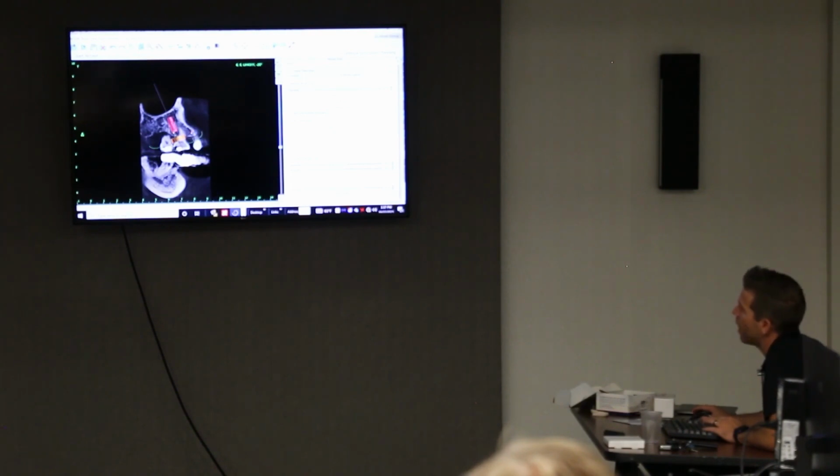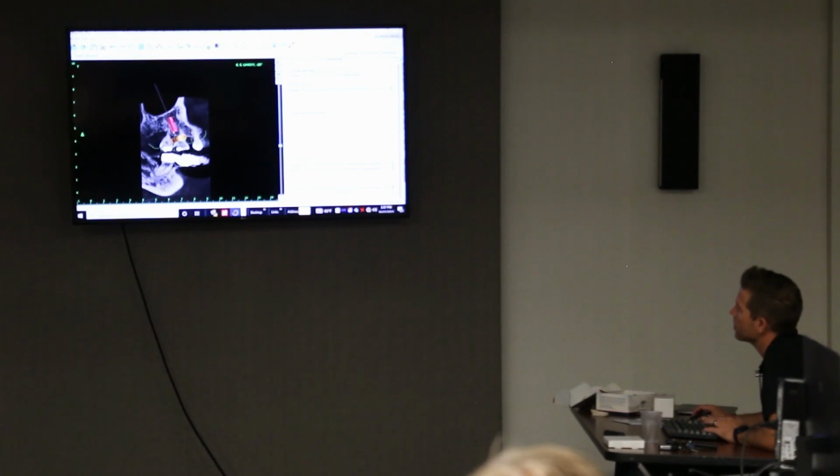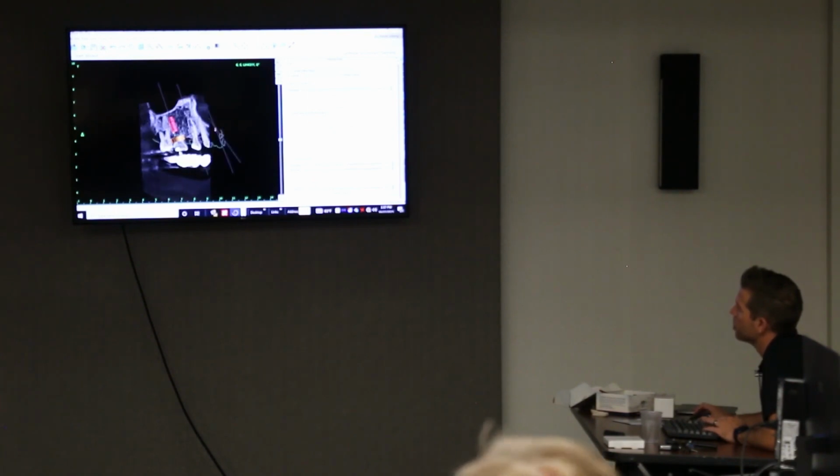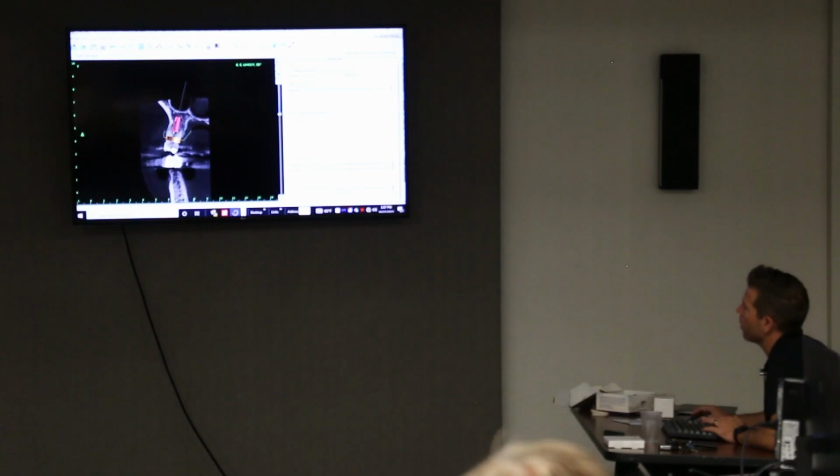And now this is a 2-dimensional view, right? So I'm editing it in 2-dimensional view. All I got to do is rotate this a little bit, and do it a little more. So I'm just dragging this mostly to get it up. Doesn't have to be way past, but I'm going to manipulate it so as I roll this around, this invagination of this green outline goes around my guide tube where I like it. Now, I'm rolling around, there we go, okay?